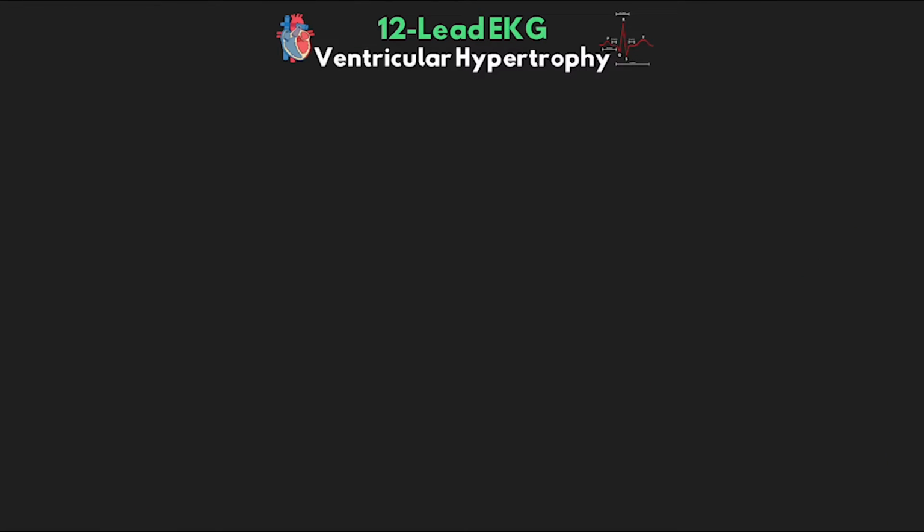All right, so in addition to seeing patterns that suggest left ventricular enlargement on EKG, we can also see criteria that would be consistent for patients with enlargement of the right ventricle, or what we call right ventricular hypertrophy.